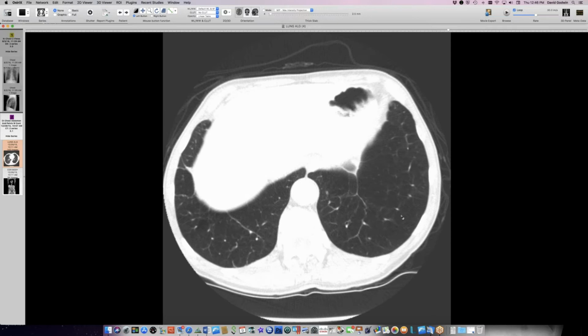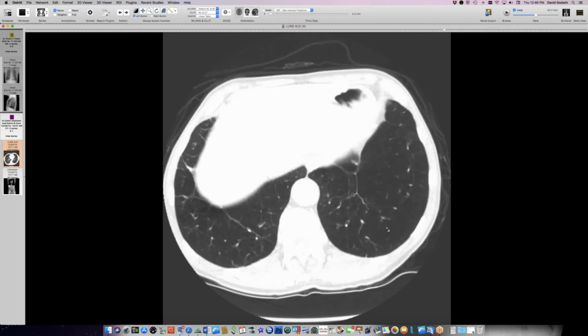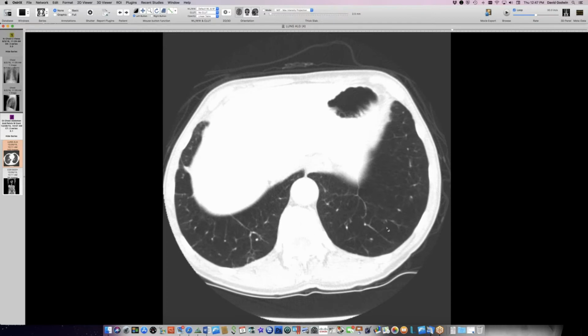This lung is expanded, but you don't really see discrete holes anymore because of the confluence. So when the emphysema goes all the way out to the edges of the lobules, it becomes harder to recognize in some ways as emphysema. So this was Ritalin emphysema just by history. So he's a cigarette smoker. I think he'd been tested for alpha-1 antitrypsin. That was not abnormal, and he did have a history of Ritalin abuse.